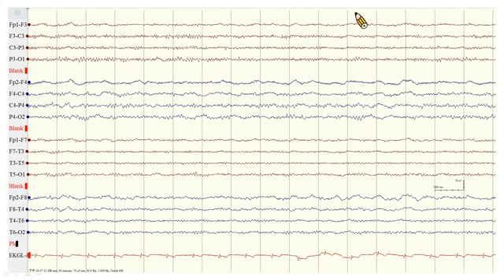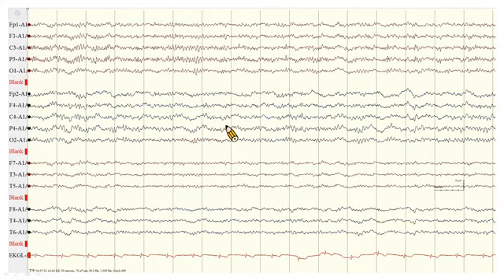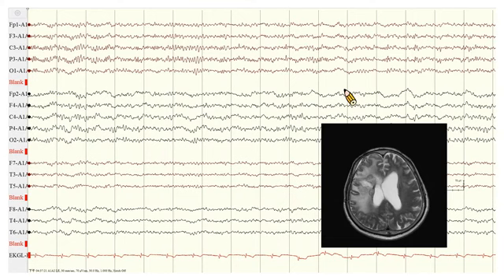Let's look at this EEG. It's double banana montage. Left parasagittal, right parasagittal, left lateral and right lateral. We can see there are nearly continuous polymorphic delta activities over right hemisphere. Let's change to A1, A2 montage. And the polymorphic delta activity still existed. So it means that here may be a structural lesion or subcortical dysfunction. It's a case of GBM over right hemisphere status post-operation.